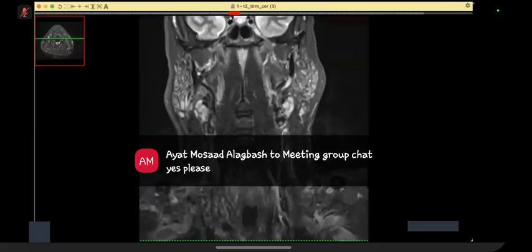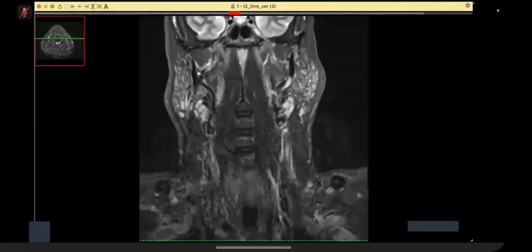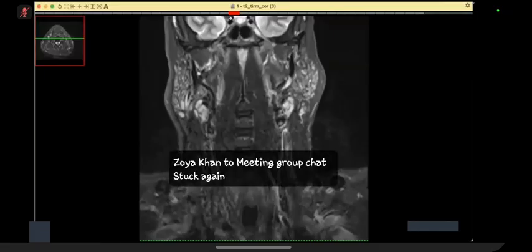Right. So, what do you think is happening within the gland? You could see these punctate high signal intensity foci. What exactly is that? So it could represent an inflammatory process if it's bilateral. It could potentially be secondary to a ductal calculus. Although I was trying to search for any low signal foci within the ducts, but I couldn't delineate that.